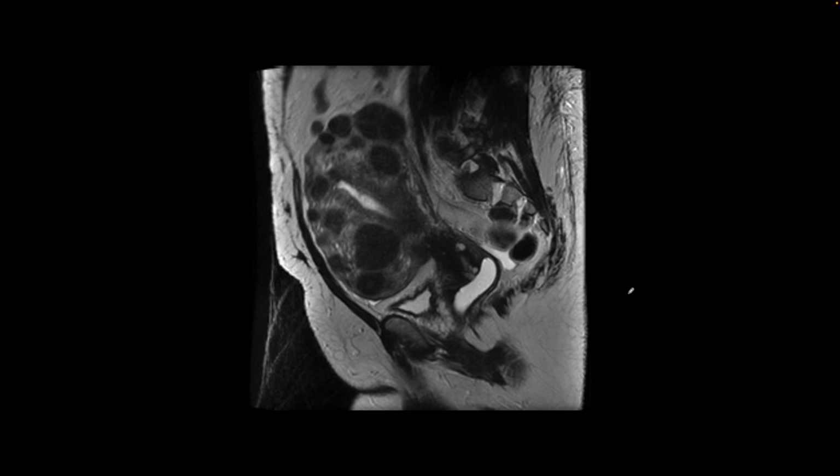This is a single small field of view T2 weighted image from MRI of the pelvis in a female, showing urinary bladder with some urine inside, vagina distended with gel, small volume free fluid, could be physiologic in this young female. There are tiny Nabothian cysts in the cervix. Here is the endometrium, and there are multiple nodular T2 hypointense foci throughout the myometrium, consistent with small fibroids.